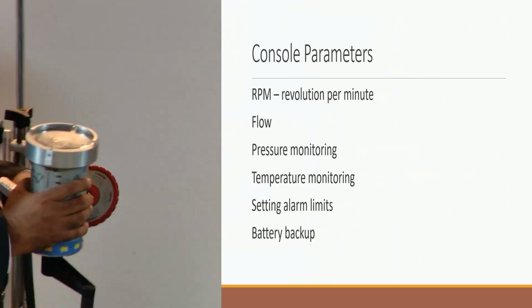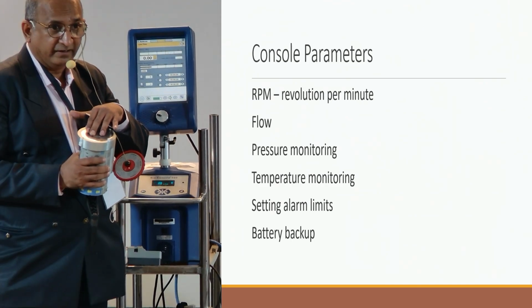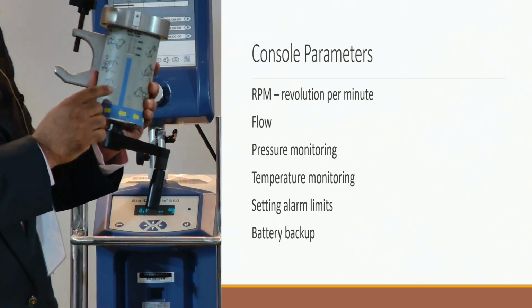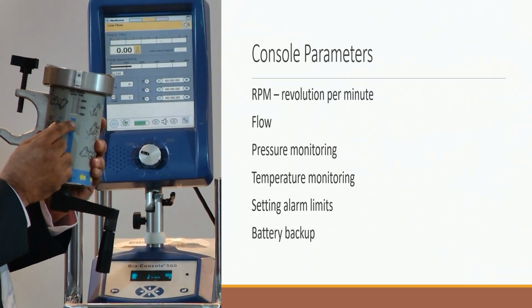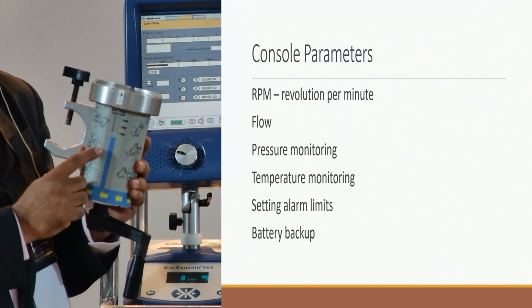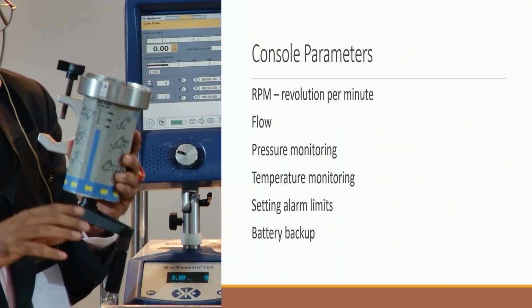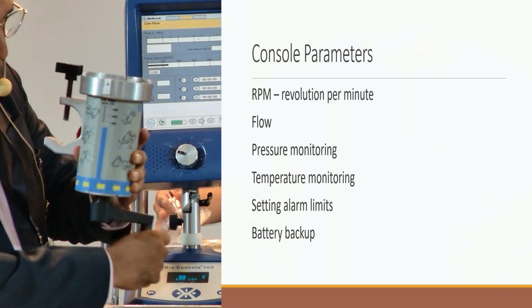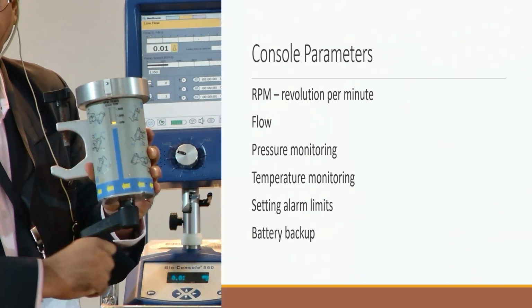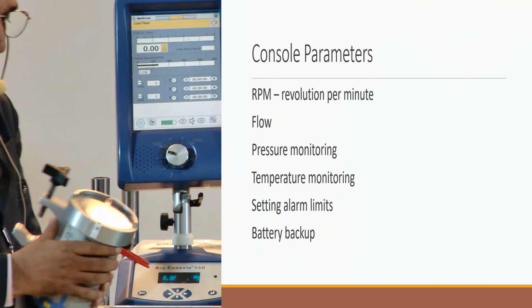So what you need to do is, you have to take the pump from here, you have to put the pump on this hand crank, and you have to start rotating manually. And there's a direction given. And if you see here, there are values here: 1000, 2000, 3000. So these are the RPM. You should know what RPM the patient was on. If the patient was on an RPM of 2000, you have to rotate this hand crank at that 2000 RPM. Okay. So this is hand crank.